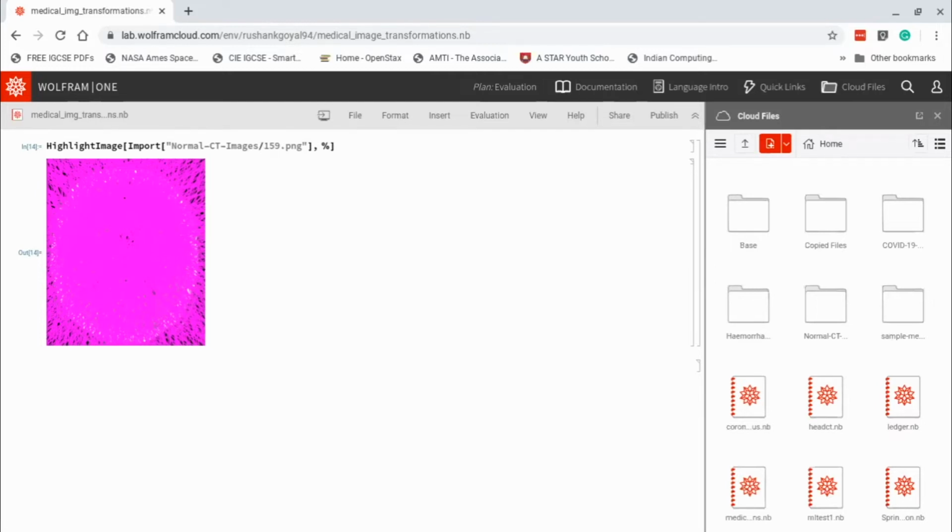So whatever organs use glucose the most, like your brain and your heart, they have a lot of it, and they appear as black spots. While most other organs that are not as metabolic just appear as white places. And if you have a tumor or cancer or some other form of disease, it's going to be really metabolic. It uses a lot of glucose. So it's also going to appear as a black spot. And that's going to be in the wrong place, because your heart is not in your legs, for example. So yeah, that's just an important image.